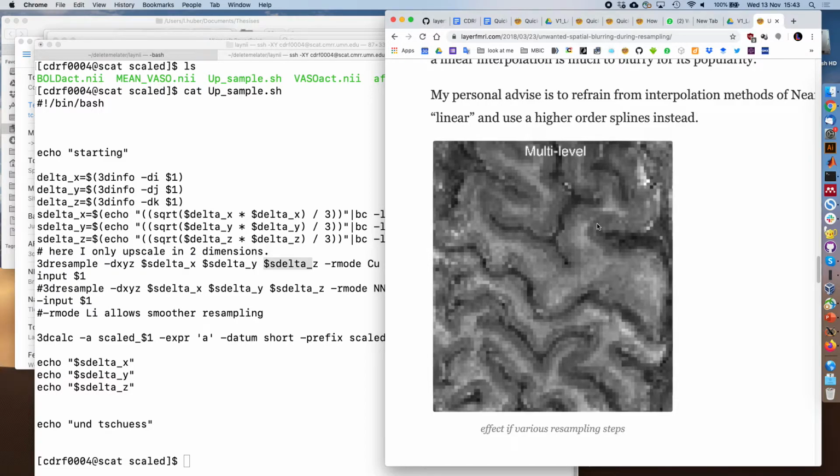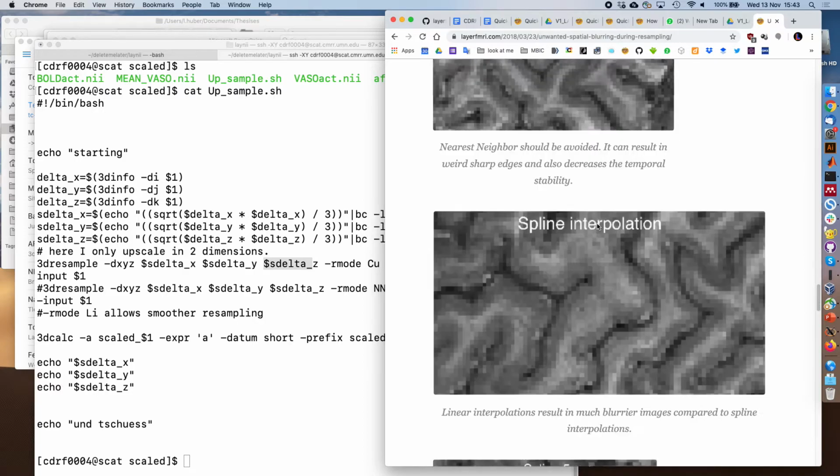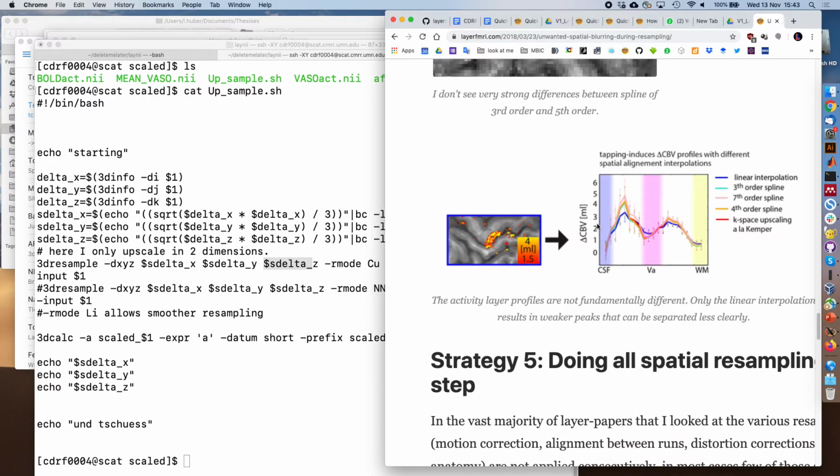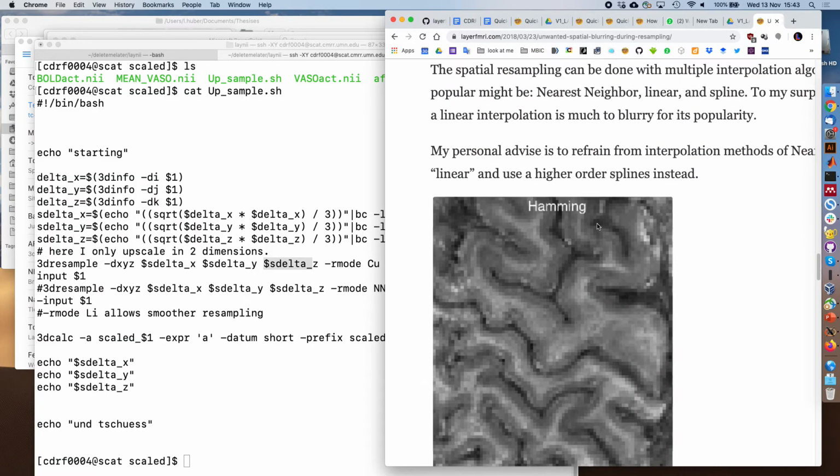So what's your recommendation? I don't care. If your result depends on the way you do your interpolation, I wouldn't trust the results. I use spline or cubic. From a theoretical argument, I suppose sinc interpolation makes sense because it does credit to the k-spaceness of the data that you've got.